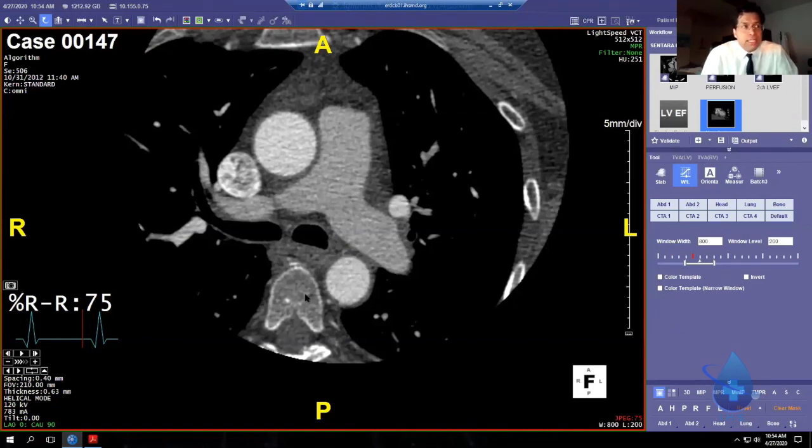Okay. The corollary of this that is very important for CT readers and cardiologists is that by changing the window width and level settings, I can make a stenosis go from 40% to 80%. So those of you who read Nuclear Donuts, you probably have heard the phrase ischemia is just a click away, right?